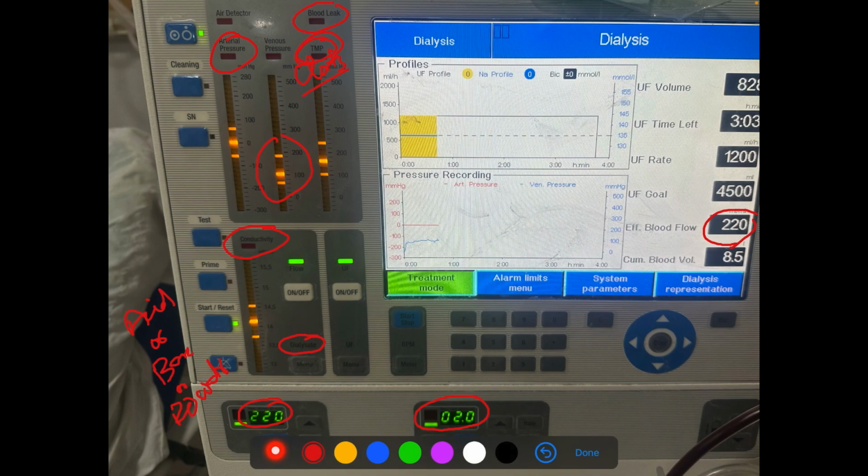Okay, I'll see in the next slide. Then this here is your ultrafiltrate, where you can control the on and off. We can switch off or switch on the ultrafiltrate, and going into the menu we can go to the ultrafiltrate settings. Okay, so again these are the numerical keypad to enter values. Okay, this is confirm. When you enter a value, you can press this, you will get a confirm. This is your escape. After putting a value and confirming, you escape to come to the main screen.